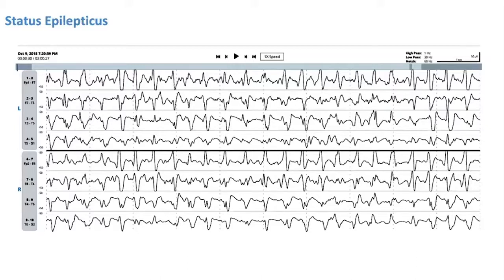Right. But I wouldn't want that uncertainty or that gray area to interfere with decision-making for patient care. And at a certain point, there has to be a consensus as to when to act and when not to act, and guidance for that in order to bring the EEG into a useful, real-time treatment decision aid. Right. So for someone who has not seen this EEG evolving into this pattern, we call it status because we have seen the EEG before this page. But even if you want to call this generalized periodic discharges, because there are 3 of them per unit of time, this definitely is a case that needs to be treated regardless of what we call it.